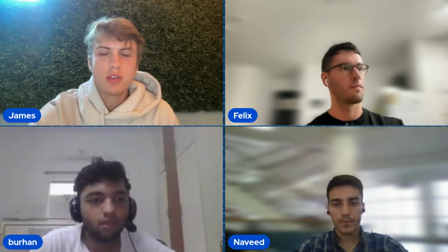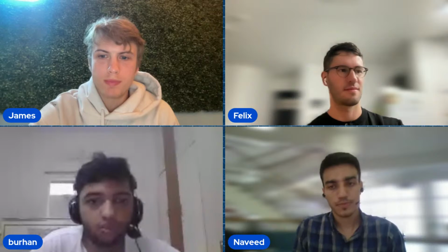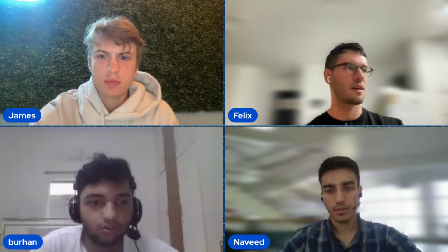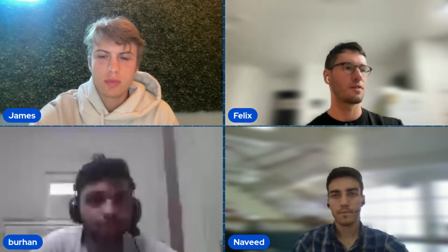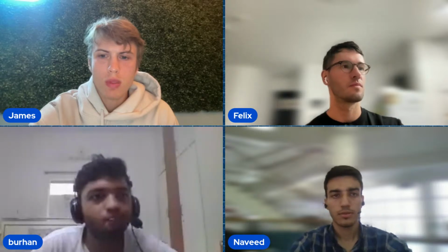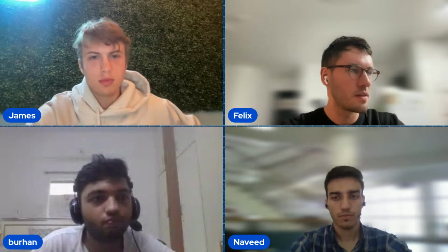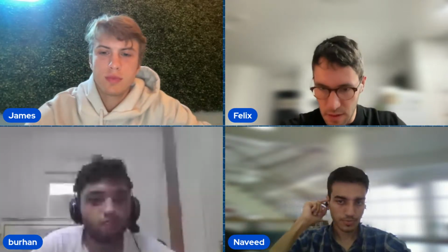Felix, how many epochs? Let me see if I can get it running. If not, then we can use that on Felix's model. I think it's done. It's 15 out of 15. Now it's done. Yeah, just now. Do you want me to share my screen again? Yep. Okay, let's see.